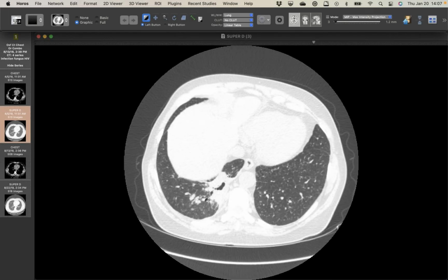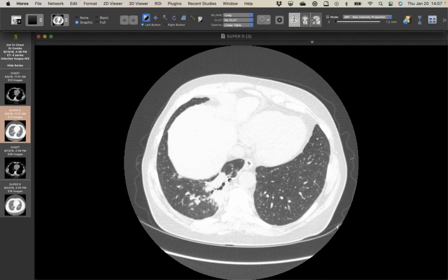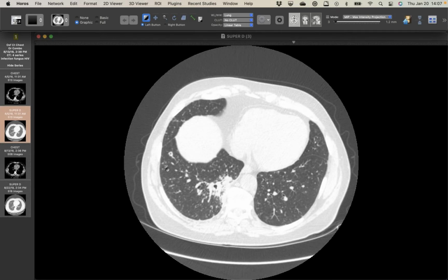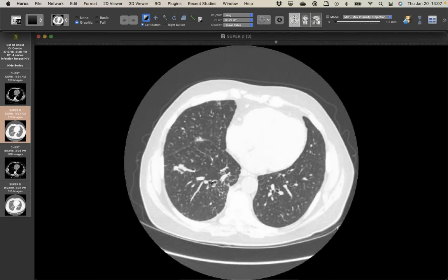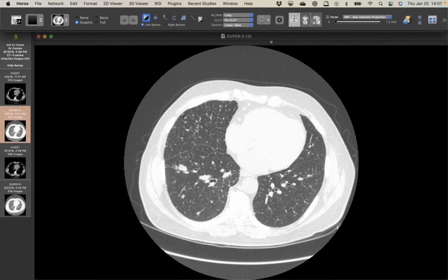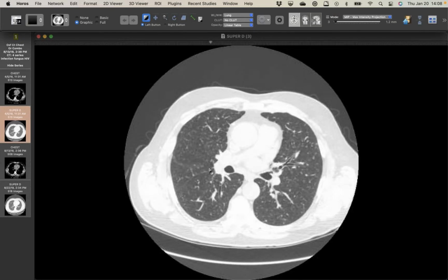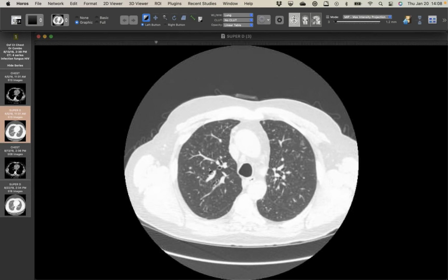And you can see there's this kind of ugly cavity here in the posterior basal right lower lobe. There's a little bit of fluid in it, but not a lot. But it's got pretty dense margins. And then you'll notice there's just a ton of nodules around it. Some are cavitary, but very discrete nodules, some little Cheerios there in both lungs. Some are super tiny, some are bigger. Given where he was, this is a great look for Coccidioidomycosis, which this was confirmed to be.